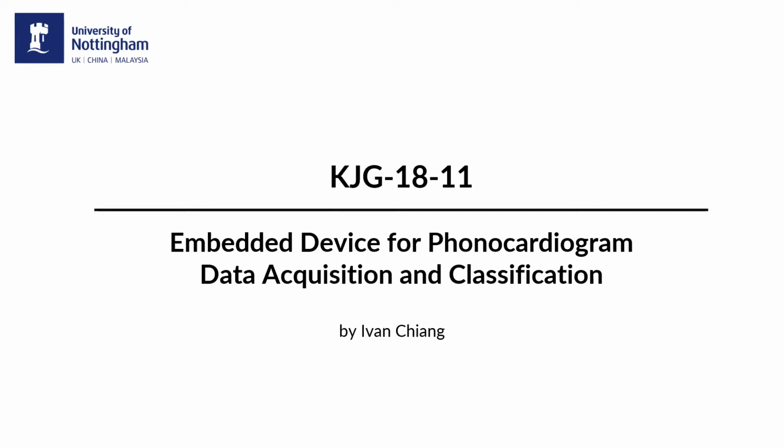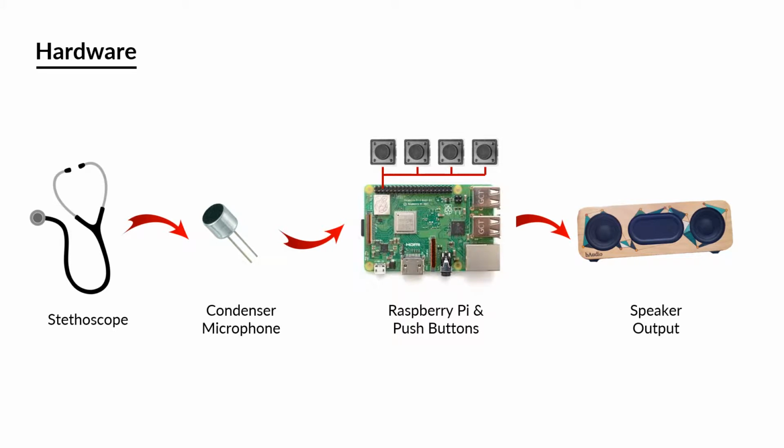Hi, in this video I'll be explaining my project entitled Embedded Device for Phonocardiogram Data Acquisition and Classification. First, I will show you an animated demo on how the device works.